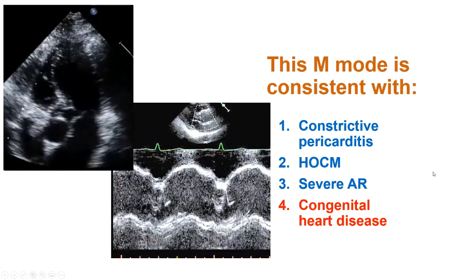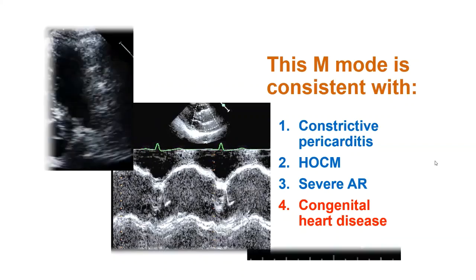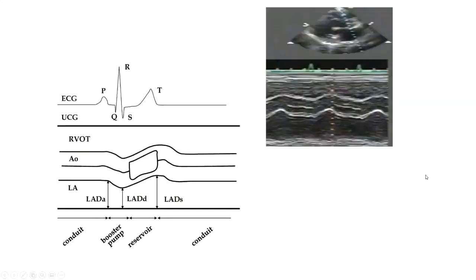And this is to be contrasted with what one sees with dynamic outflow tract obstruction, like I showed you here. This opening and closing tends to be very early before the main aortic valve envelope, which is not well seen here, as opposed to dynamic outflow tract obstruction, which one sees in HCM and other conditions where the closure is the mid portion of systole.